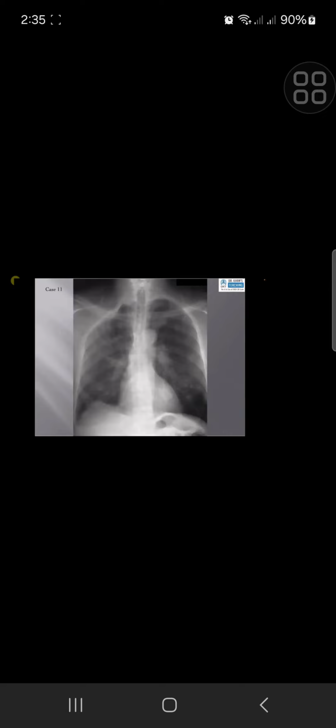So I've been provided with a frontal chest radiograph of an adult patient. Now here in this chest radiograph, there is a striking abnormality where there is asymmetry within the contours of the ribs within the right lung apex compared to the left. So they're a bit more medially deviated and flattened. Perhaps there's an element of surgery here or previous trauma. And within there is tenting of the right hemidiaphragm.